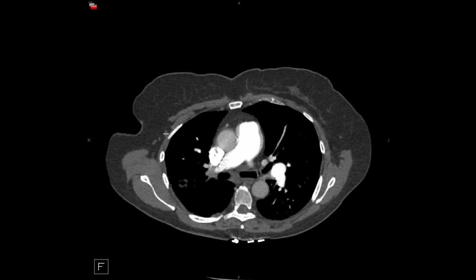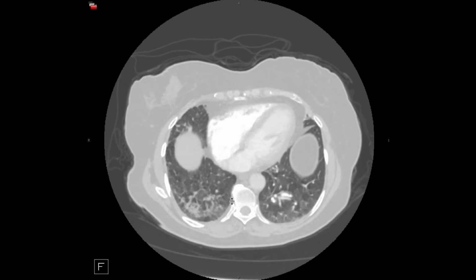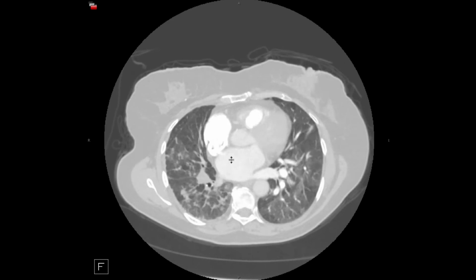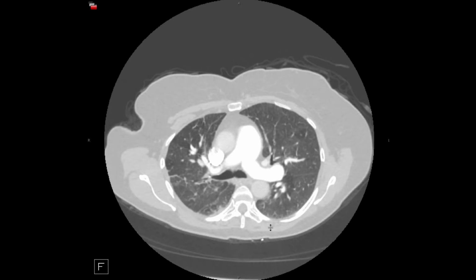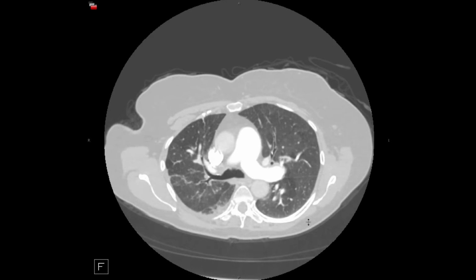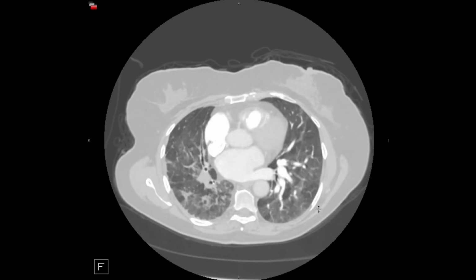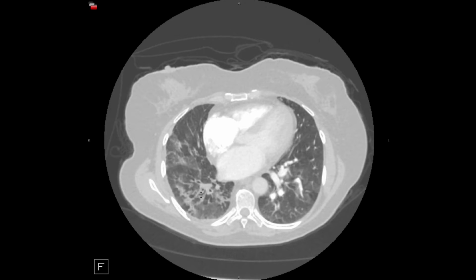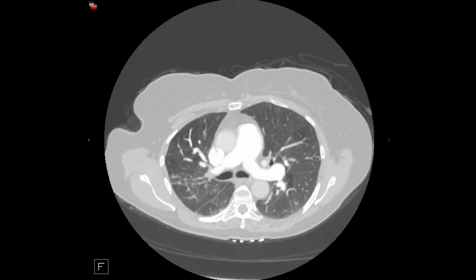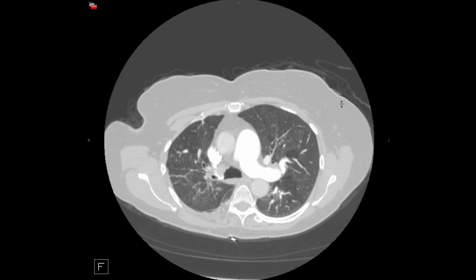You can see that we've got extensive scarring and fibrosis in these areas of the lung that are ischemic. And then, of course, extensive mosaic attenuation within both lungs. Interestingly, this patient was labeled as potentially having chronic hypersensitivity pneumonitis with a non-contrast study, given the presence of fibrosis and extensive mosaic attenuation. But the clinician astutely observed the patient's pulmonary hypertension was out of proportion, and so they did this PE study which showed the chronic pulmonary embolism.